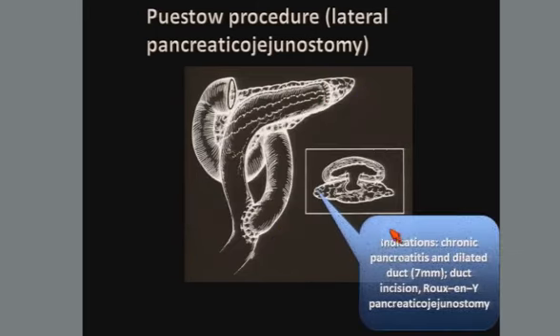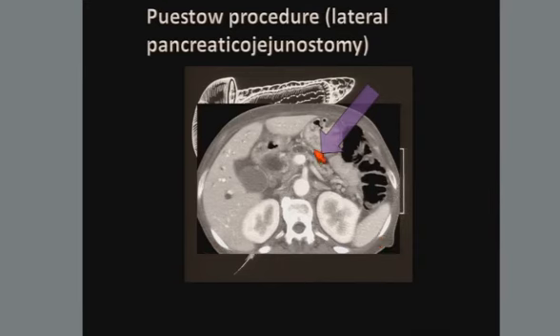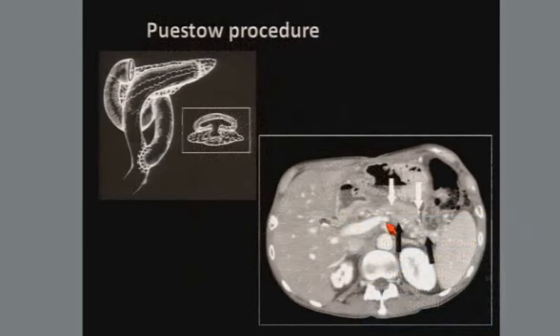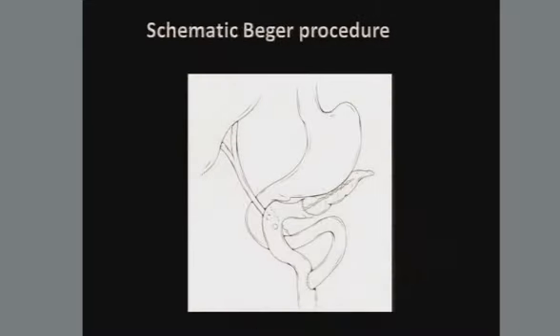So these patients tend to have a pancreatic duct that's dilated up to about 7 millimeters, and the loop of jejunum will drain this dilated pancreatic duct. The idea is that that will cure their pain. Doesn't always work. They'll ask postoperatively, is that pancreatico-jejunal anastomosis intact? And all you can do is infer that it's intact and working if the pancreatic duct is not dilated. Here are a bunch of little stones, but the pancreatic duct is now being drained nicely into that pulled up loop of jejunum.